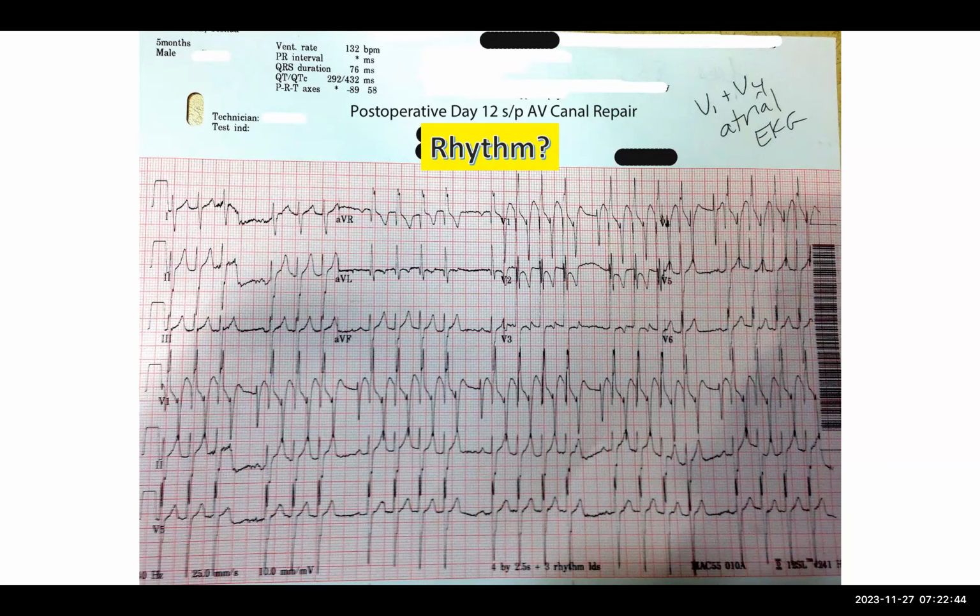Now remember, you have an atrial electrogram, and you always have to think: is there a P wave buried in a T wave, possibly? This is nice because somebody has very nicely labeled what they've done, and has created for us an electrogram, which should clarify the relationship of the P waves to the QRSs, or if there are in fact P waves.